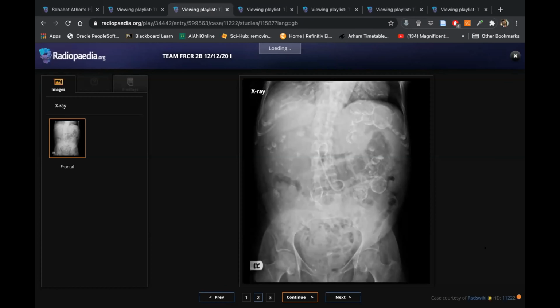Genetic disease means like it's inherited. Yes. So in that case, and we are doing GU and MSK. Yes, that is right, the rest will not come. So it's tough, I know, but in that case, I'm thinking of the calcifications which are diffusely scattered. Trying to find out whether the renal outline is clearly seen in this patient. Excellent. So I'm thinking of the possibility of renal disease.